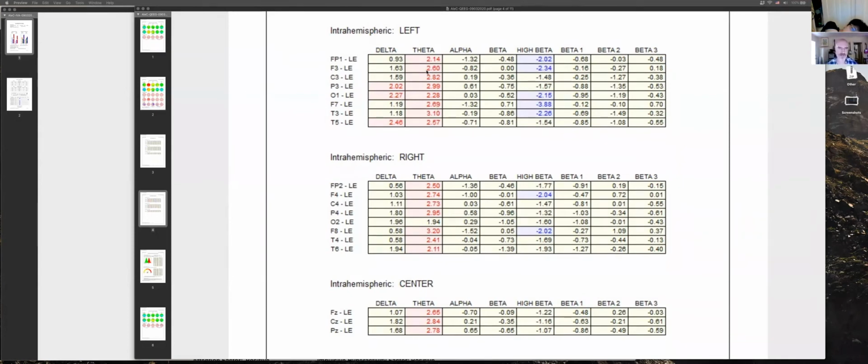So it's confusing the database. That's why the whole column's red basically. So delta is not being made enough at night when you're deeply asleep. So your brain's making it all day long. Little brownouts and micro sleeping happening because you aren't getting enough sleep at night probably.